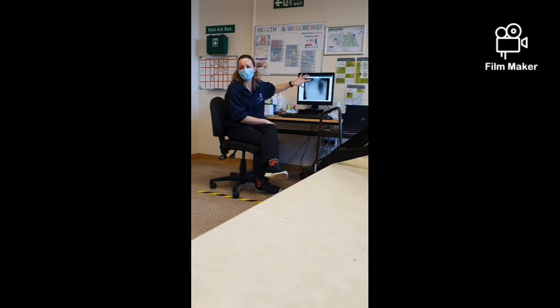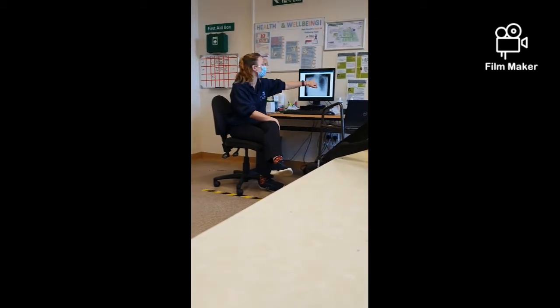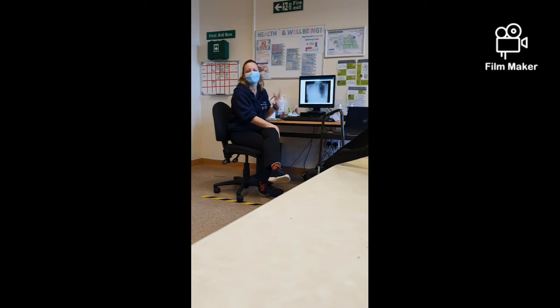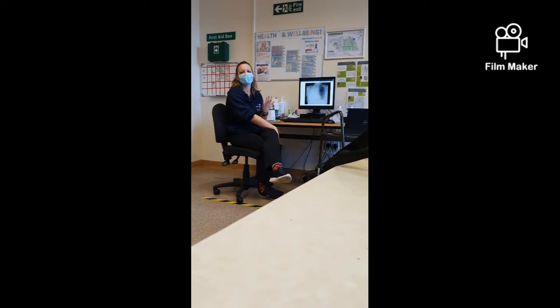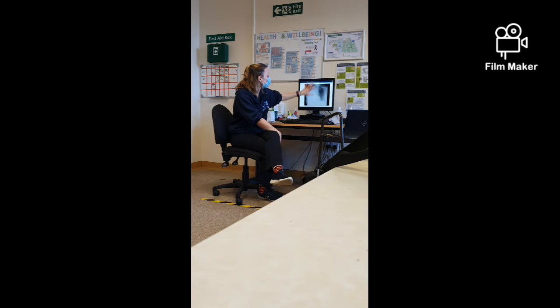So the one thing that we can't do on this is look at demographics, because obviously we're not allowed the patient information. So we would have looked at demographics first, but it does tell you here that that is the left-hand side and that is the right-hand side. And that's common on a chest x-ray. You've got to remember when we're looking at it that it's opposite to when we're looking normally. So yeah, the left-hand side. So you've got that deviated trachea. Okay, so that's your airway done.